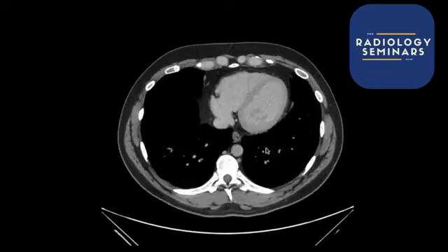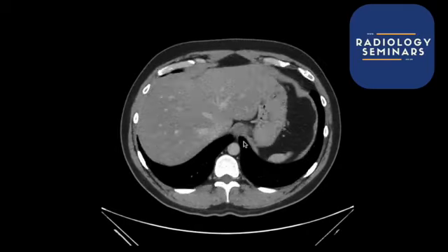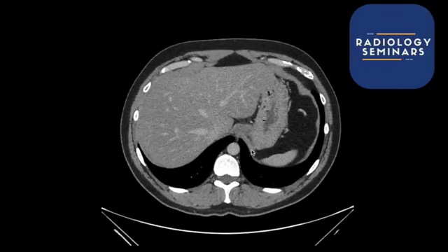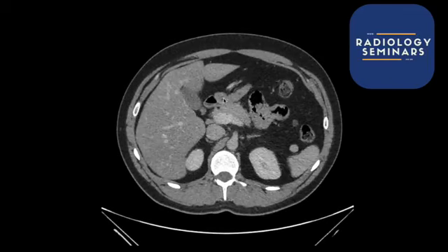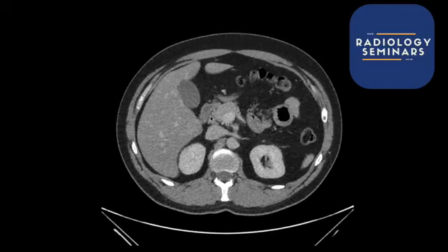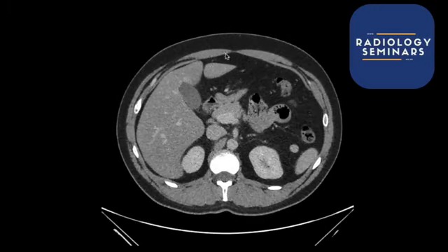I think let's just start from the top. You want to see whether they've got any hernia, so that's the esophagus coming down here, and you want to see whether they've got any outpouching of the stomach, and you want to have a look at the stomach as well. And as you come down, you'll have your pylorus, and you've got your first part of the duodenum.